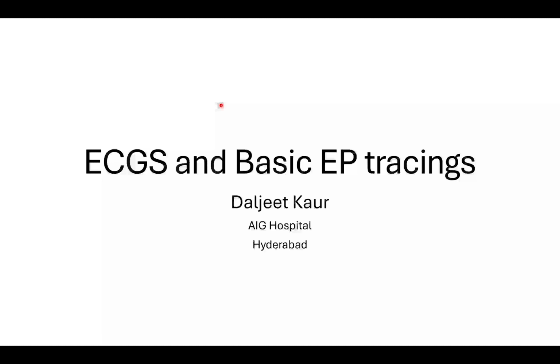I'll not go into the complicated ones, but the commonest ones which we see in clinical practice, which is AVNRT, AVRT, or atrial tachycardia, or for that matter, how do we know it's a VT or supraventricular tachycardia. I'll show some basic EP tracings.